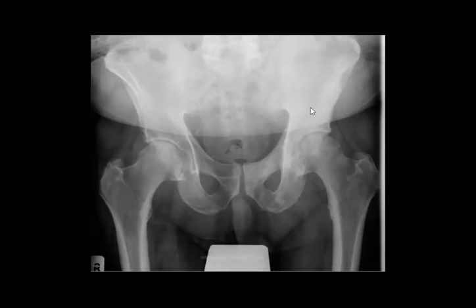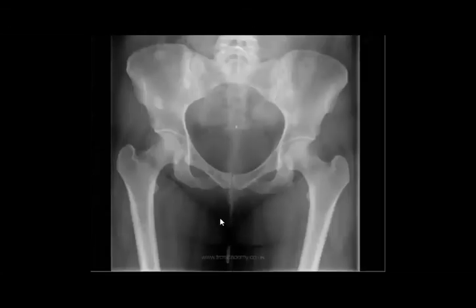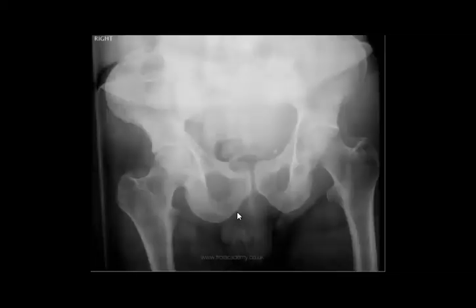Again, you have sclerotic lesions everywhere, so you are expecting the same. Another patient with multiple sclerotic lesions. Again and again, and this is a female patient. Again, you have multiple sclerotic lesions. Maybe here you can think that the sclerosis is diffuse, right? Yes.